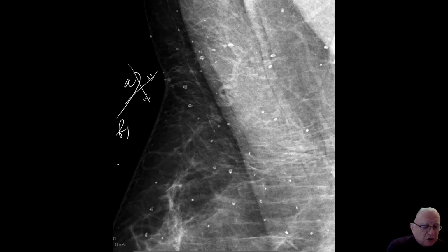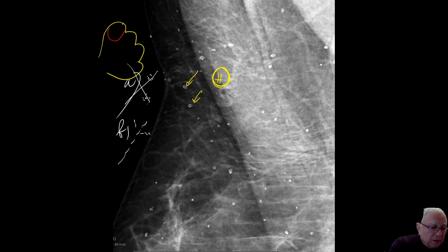Are they localized within ducts? No. They are bilateral, scattered, and each and every one has a hole in it. Take-home message. Hollow calcifications never represent malignancy. Because if it is in the TDLU, with the acini containing the large number of cancer cells, and among them the necrosis, and occasionally the calcifications. You see, the calcification is within a hole.